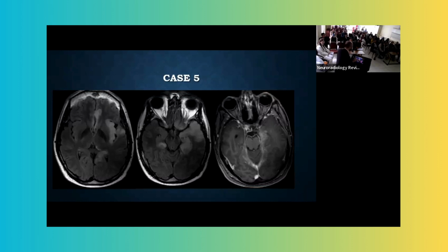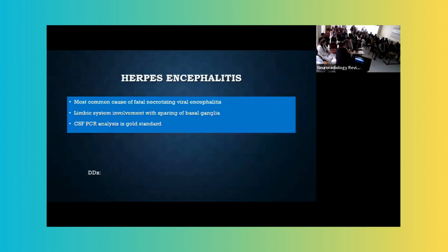But look at this. We talked about leptomeningitis. Even the viral infection is causing leptomeningitis here. Can you see the basal meninges here? They're enhancing abnormally. And we also see the medial temporal lobe, which is showing some enhancement, okay? So some worrying things about this.